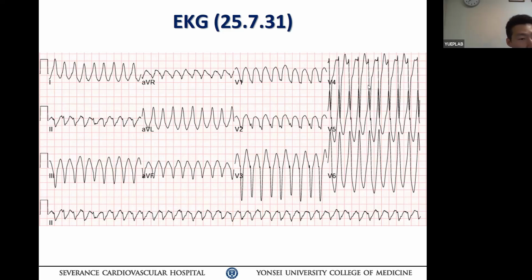So I'll go first. So here we see the QRS progression. V1 and V2 are pretty much the same in amplitude, but then in V3 it's more negative, V4 is more negative, then V5 becomes positive. So there's a transition in the V4, V5 area, which suggests that may be the focus of the arrhythmia, and it's moving out from there.